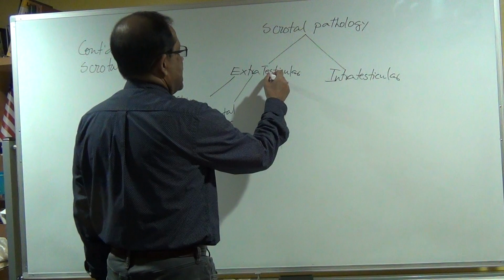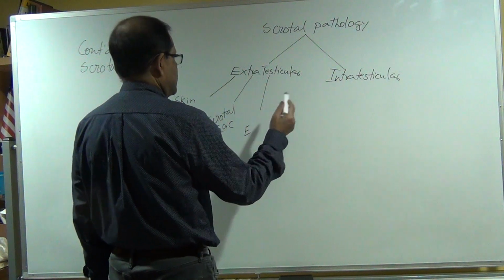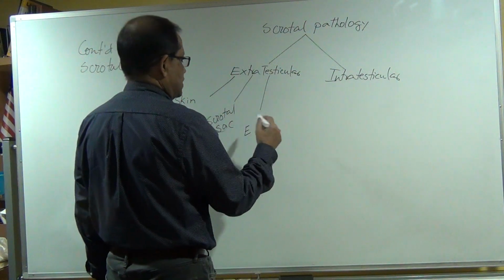Okay, and you can see the epididymis is outside the testis, but you can consider as an extra-testicular.